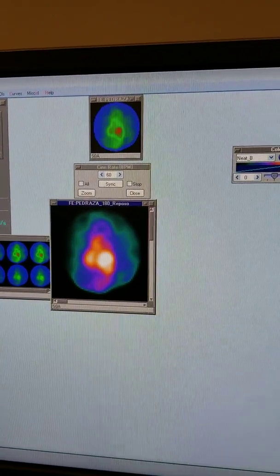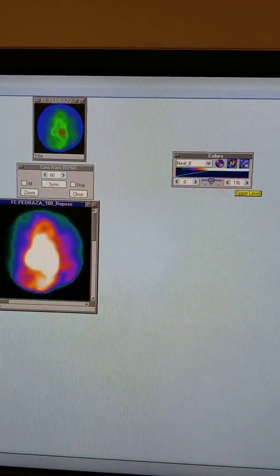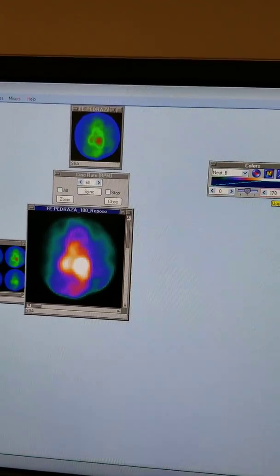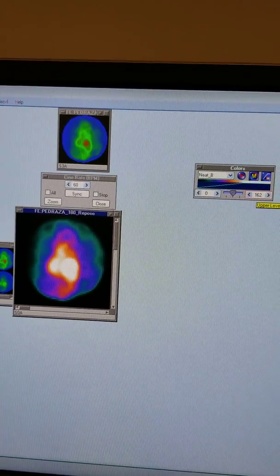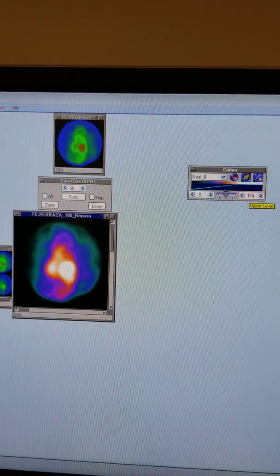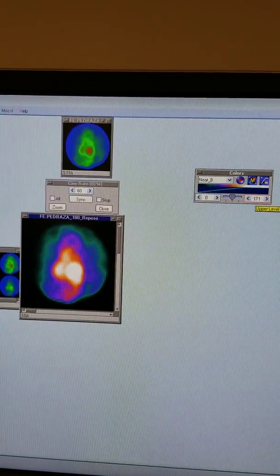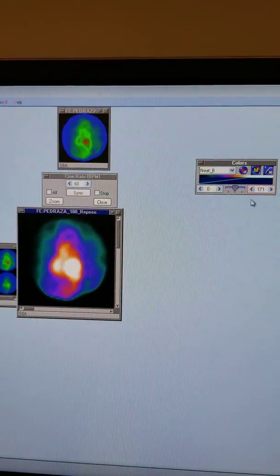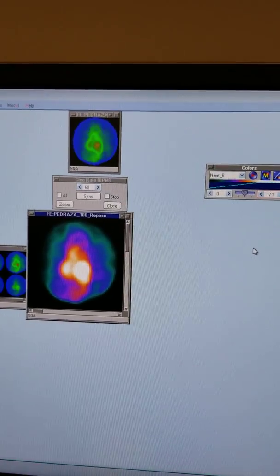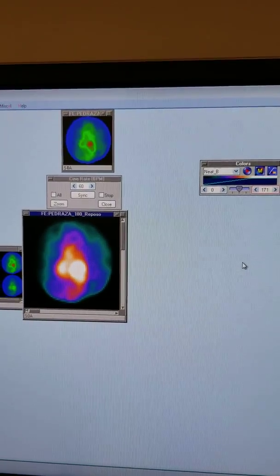Okay, so as I'm lowering this down, you'll see what's happening to the heart there. I like 165 to 175. Okay, the only thing on your brightness here is that you want to be able to clearly see and define the ventricles from one another. And I find that that occurs between 165 and 175. You still want it pretty bright to be sure that you're getting everything in. So for this, I'm going to probably settle at about 170. So no lower than 165, you'll lose that ventricle separation.